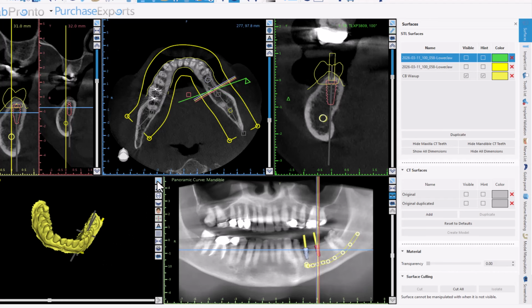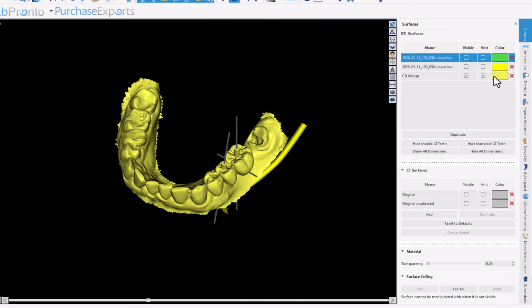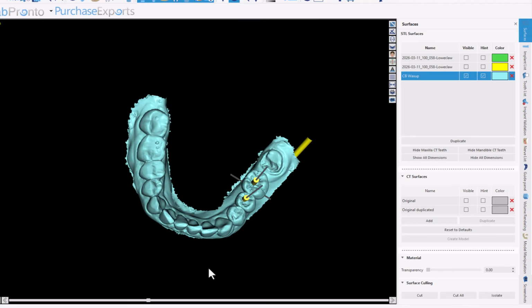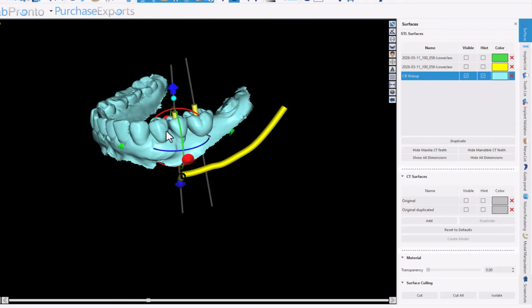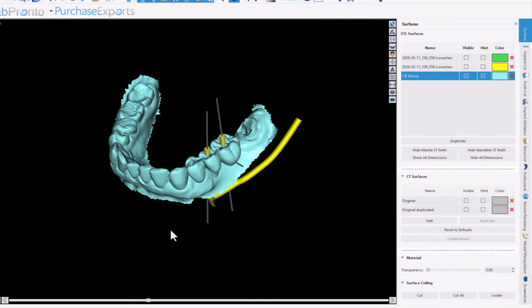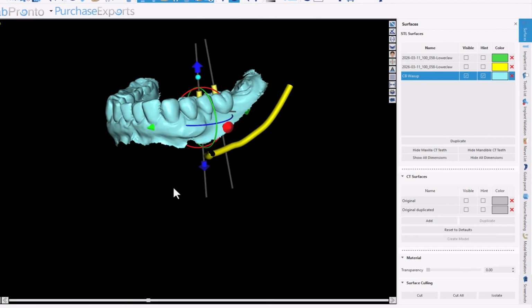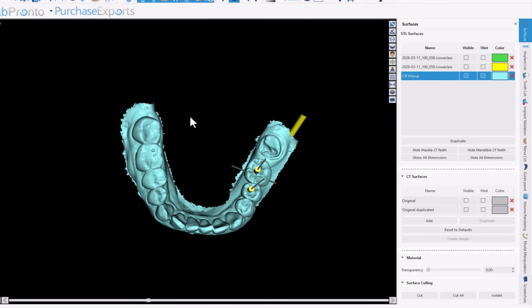Okay, so now I know. Let me change the color on this model so you can see it a little more clearly. But now I've got my 2 implants right where I want them relative to the future crown on number 21 and the position of 19 and 20 that works with the occlusal scheme that we've got set up in Blue Sky, in ExoCAD.